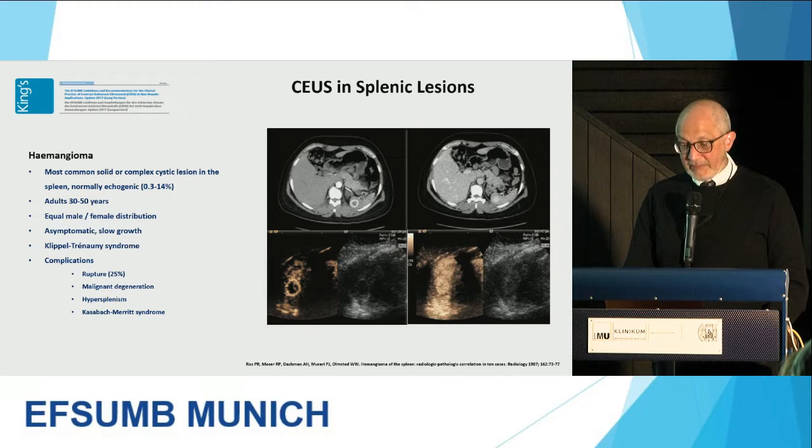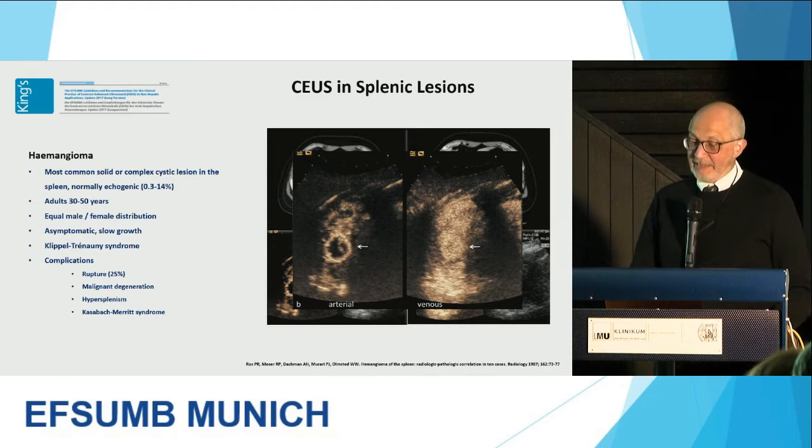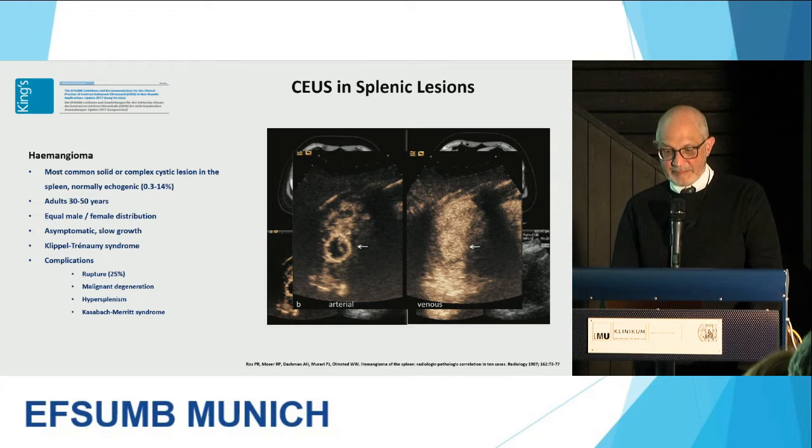And here are comparable images of the CT and the contrast-enhanced ultrasound to show you those appearances quite clearly with infilling of that lesion in the portovenous phase, and the later phase on the contrast-enhanced ultrasound. So this is a very classical hemangioma, which you won't see that often in your practice.